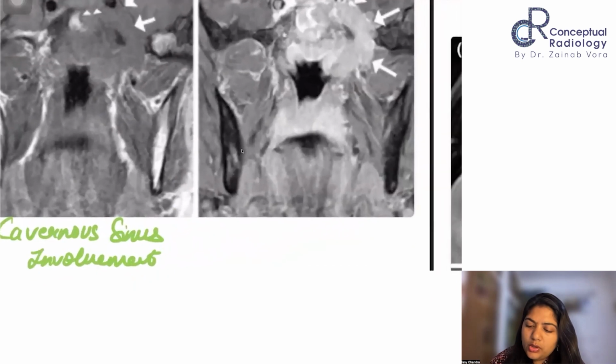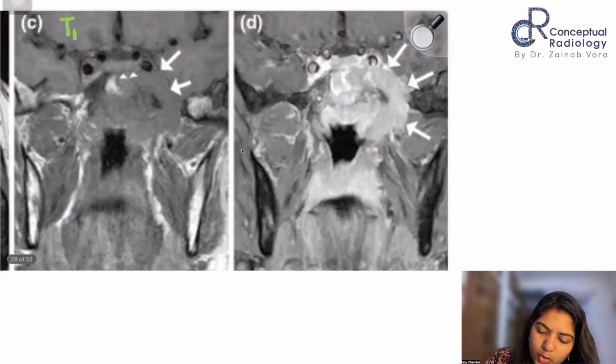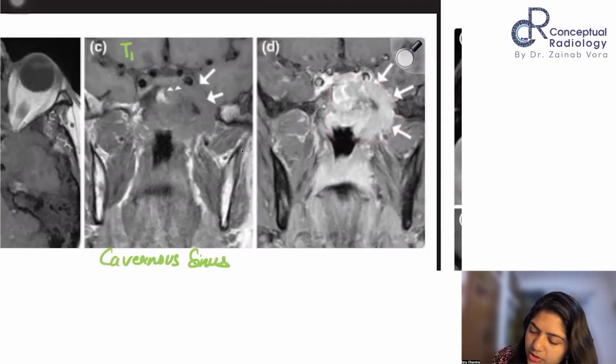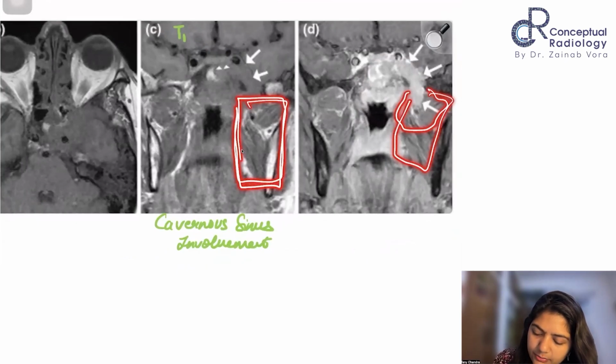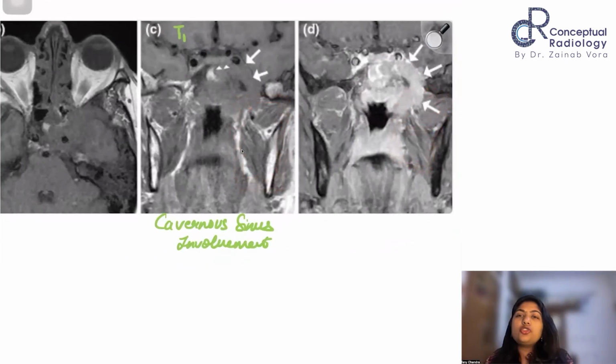Now, if you look at this soft tissue on the post-contrast images, this whole thing is enhancing. Also, this enhancing structure is also extending into the masticator space. What is this space? The masticator space in the infratemporal fossa. So whenever you have this kind of extensive spread, again, we are down to a malignant. So you have to see for the epicenter of the mass.